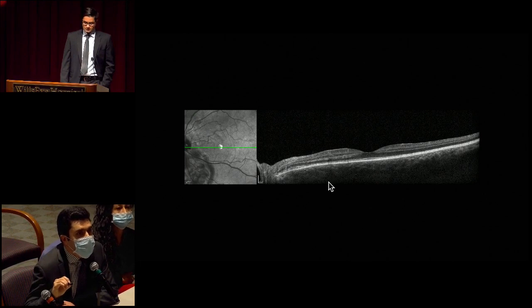Looking at the retinal laminations itself, they are much more normal compared to the fellow eye, and these hyperreflective areas, given that the image is tilted a little bit, it just might be Henle nerve fiber layer artifact, and maybe some disruption of the outer retinal layers here towards the disc, corresponding to these changes we see on the infrared image.